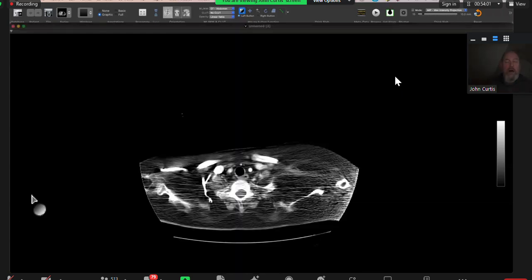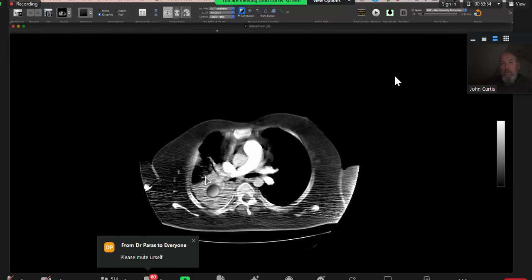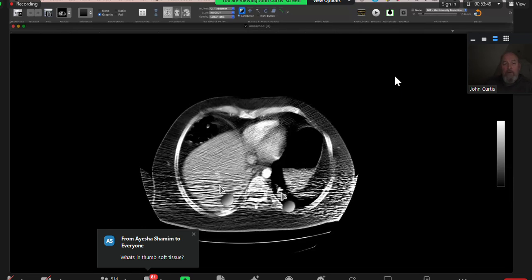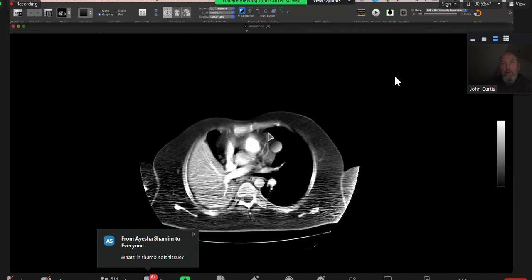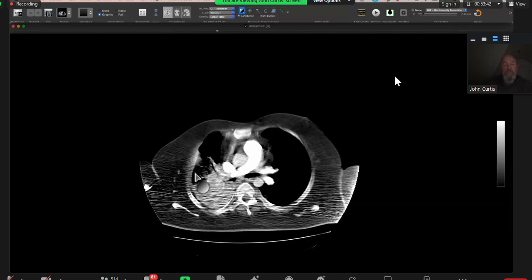This one, you're not the only person to stumble with. The patient has clearly got middle and lower lobe collapse. There's some consolidation in the left lower and right upper lobes, but there are no muscles, and all the muscles have turned to fat. And these patients unfortunately die before they get to the age of about 30, because they've got muscle atrophy and the muscles turn to fat, and it's X-linked recessive.